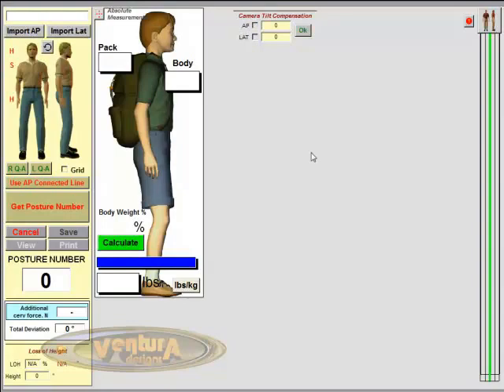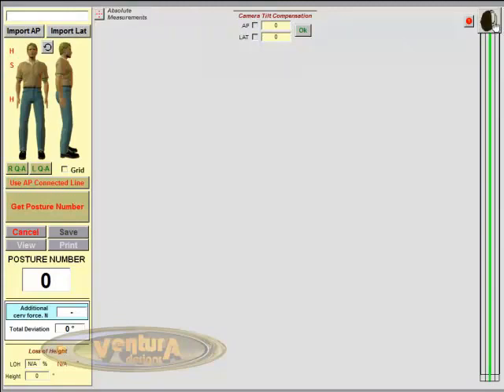Many of our clients it does, as they do back to school screenings, or they go into a school district and do backpack exams and have lectures on backpack safety. So at this point, I believe I've shown you all the nuts and bolts of Posture Pro and how to do the exams. Any questions at this point?